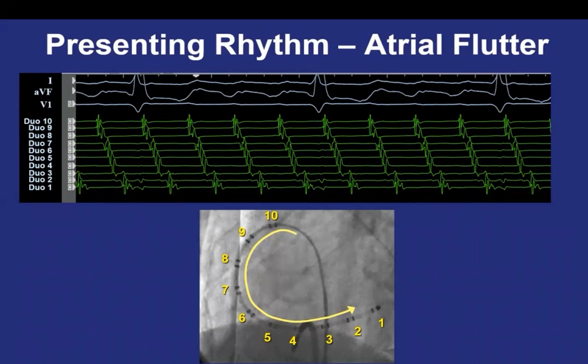You mean the early activation? Early activation applies in all situations, during pacing and without pacing. For example, if I put my catheter during sinus rhythm in somebody who has a lateral accessory pathway, definitely I'm going to get the activation of the left atrium earlier than the left ventricle, earlier than the right ventricle, for example. Both, all of them. If I put my catheter and the patient went into tachycardia spontaneously, I will record the activity and see which area is activated before.